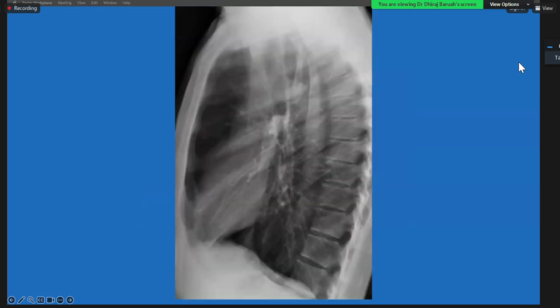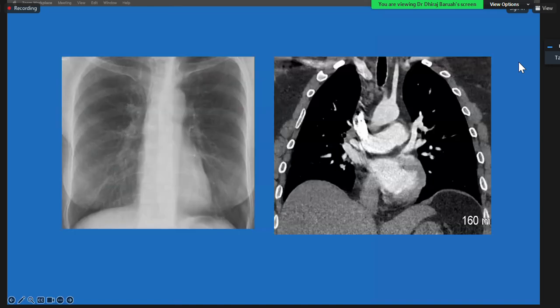On the plain X-ray, what you mainly see is the left upper lobe bronchus. This left upper lobe bronchus is hyparterial, so it lies below the left pulmonary artery. The right pulmonary artery is out there anteriorly, and this bronchus is the main one you see on X-ray. For detailed relationships, you will have to look at the CT scan to understand the hyparterial and eparterial bronchial anatomy.